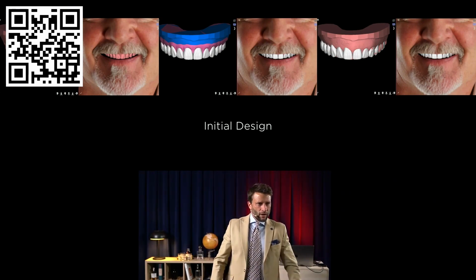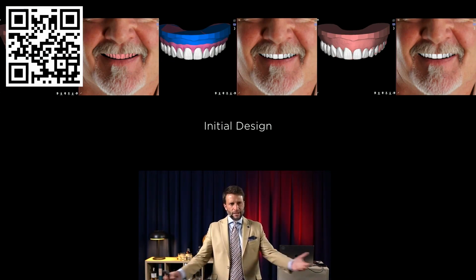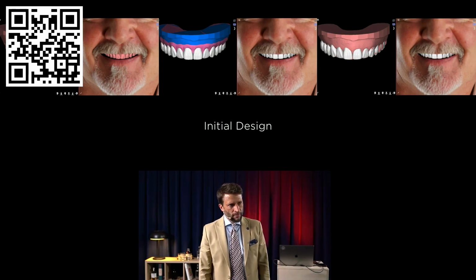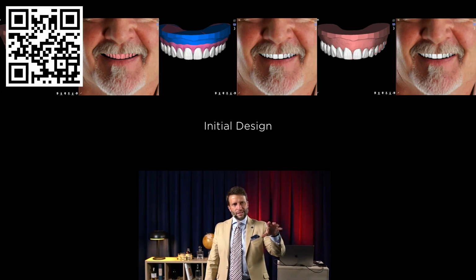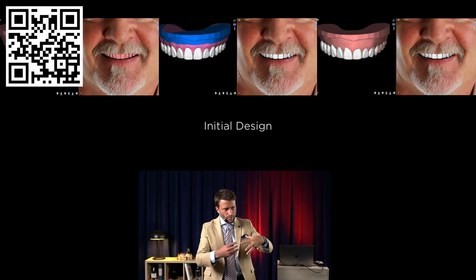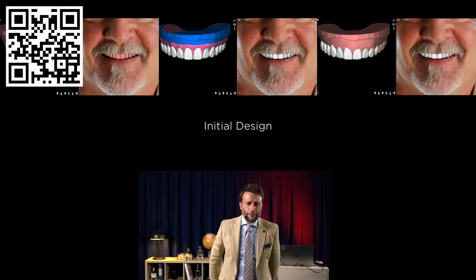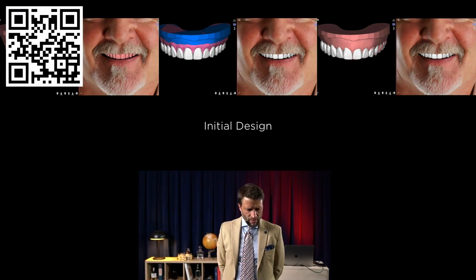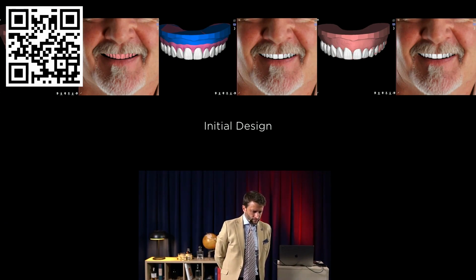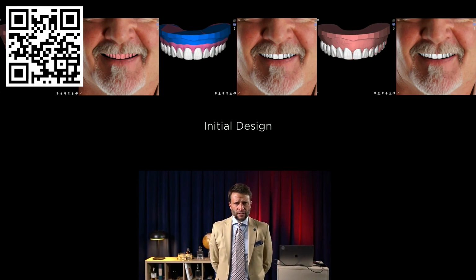So you have a patient with a full upper removable denture, like many others, nothing special there. The doctor scans the patient, scans the ridge, scans the denture, and sends all the information. We overlap, we do the smile design the best we can, like always. It looks good in the face. We are happy. And probably, if we didn't care about proper planning, we would just send this back to the dentist.